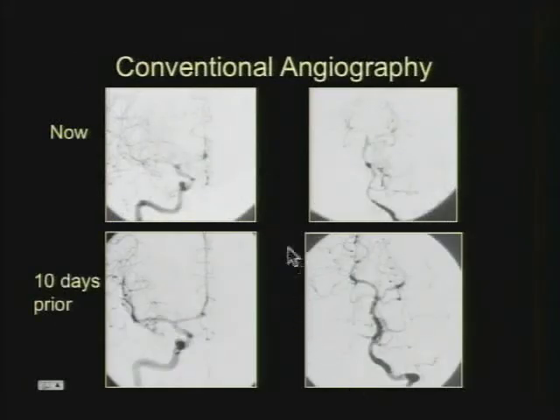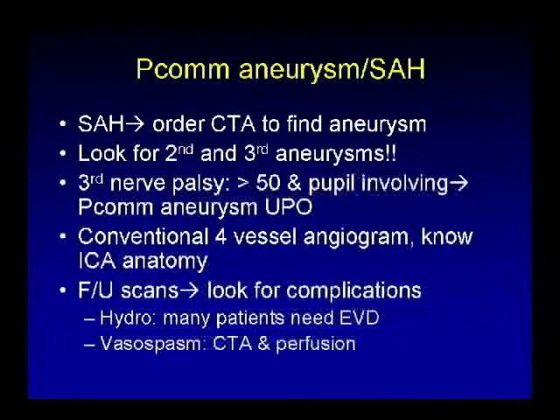And in this case, when you compare the angiogram at the time of vasospasm to the pre-treatment, you can see really severe diffuse narrowing involving the A1 and M1 segments compared to the preoperative study. And you can see narrowing involving the right PCA, the basilar artery, and vertebral artery, really diffuse vasospasm in the posterior circulation also.